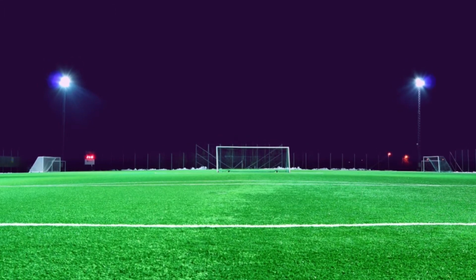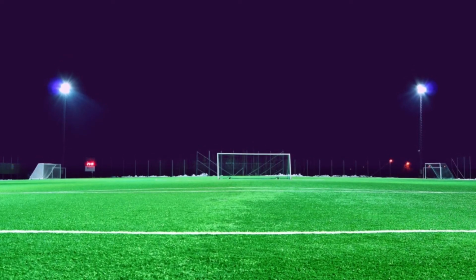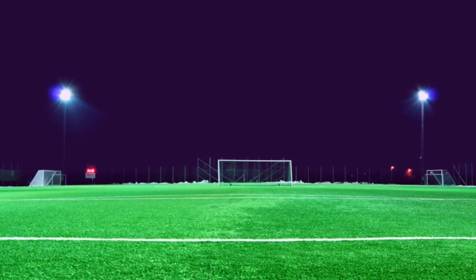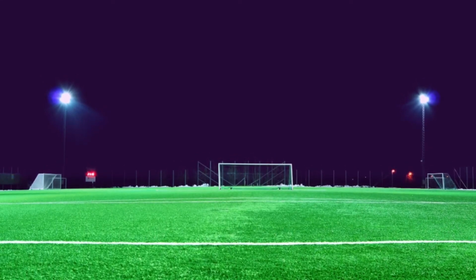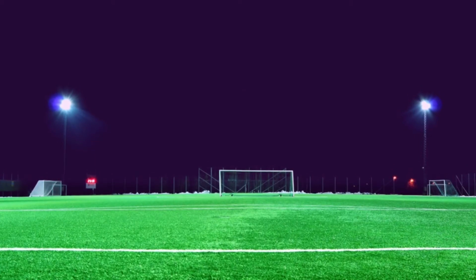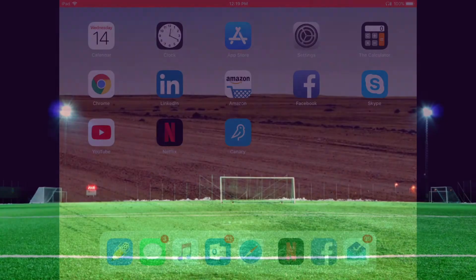This tool is extraordinarily beneficial to any coach, parent, or organization wanting to better track the concussions of their athletes or their children. I'm going to take a few minutes to walk you through the app right now. I'm going to try and fit it into a 10-minute video, so feel free to reach out to anyone on our team if you have any questions after this video.